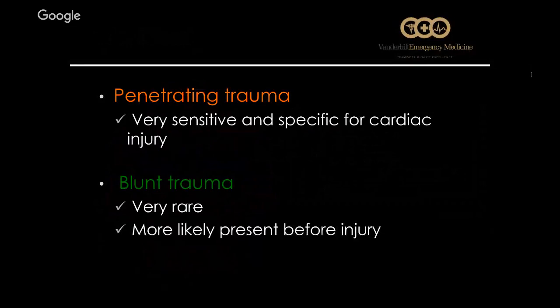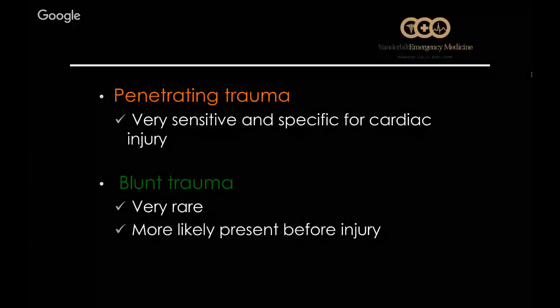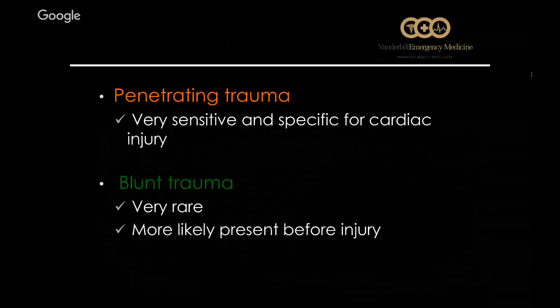It can be extremely important in penetrating trauma. Hemopericardium is extremely rare in blunt trauma. It may occur more often, but most of the patients that have this issue from blunt injuries oftentimes, unfortunately, don't make it to the hospital. Next slide.